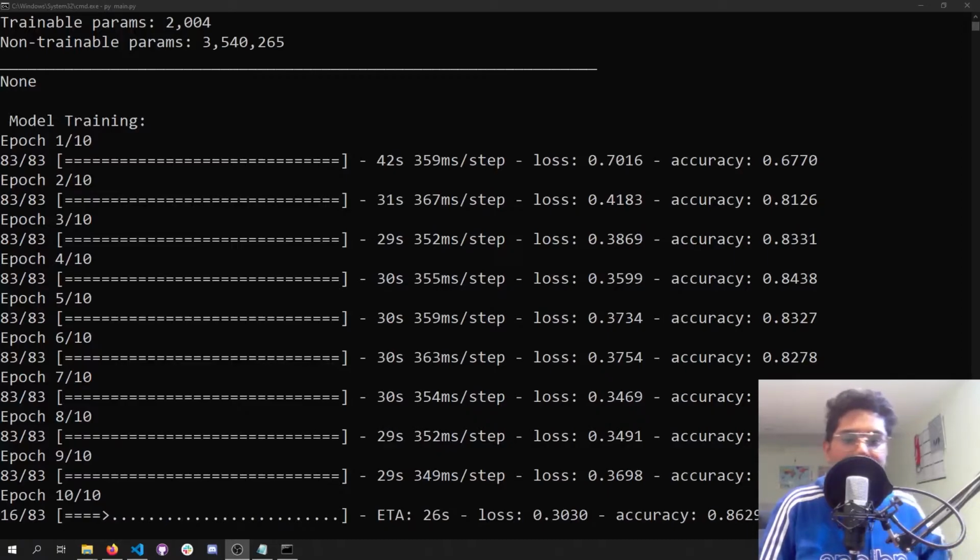Okay, welcome back everybody. We're now on our last epoch of training, and as you can see, the model is reaching accuracies of 86%, which is a lot higher than what we reached before while just building our own CNN. And this kind of just goes to show the power of transfer learning, right? This application can be used in endless situations. So just as a general note, transfer learning is a super powerful thing that we can use in almost any situation.